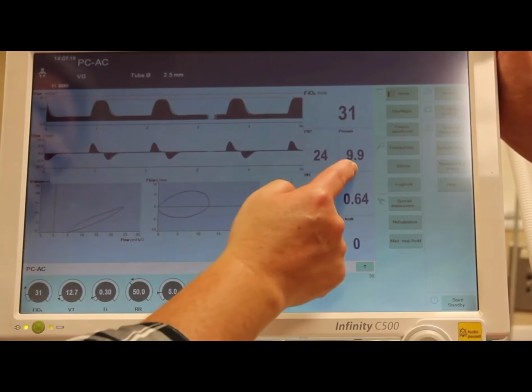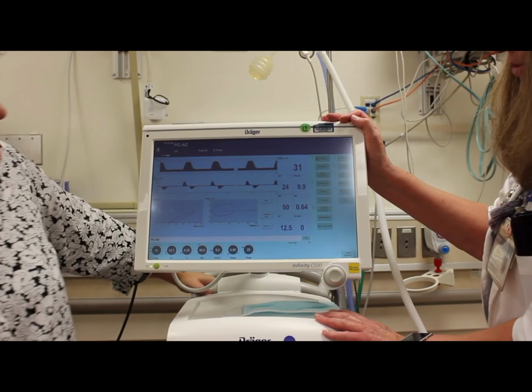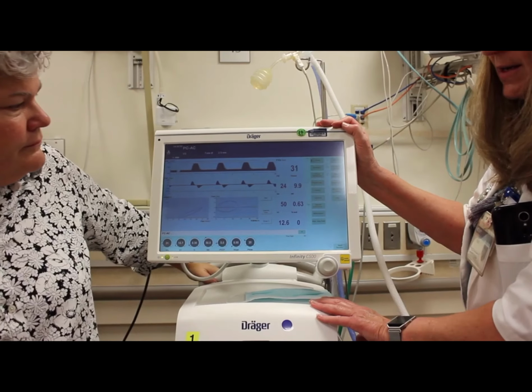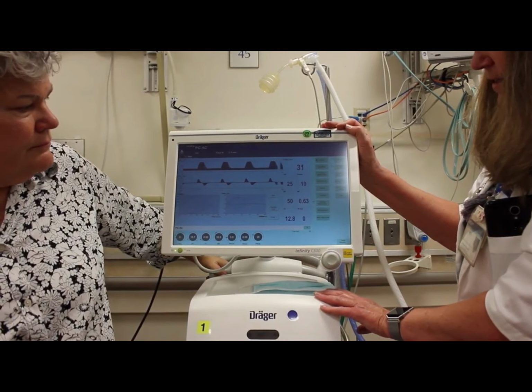The mean airway pressure, can we use that to decide whether or not the baby's ready for extubation? Yes, we can. You should watch, and it should be going down, and when it gets down to 10 or less, that's a good sign that the baby is ready to be extubated.